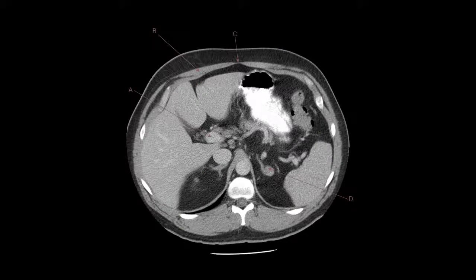Alright, structures noted again. What do we look at? You got your left suprarenal gland. So there's that. Also known, of course, as the adrenal gland. It's on top of the kidney because we're not quite to the kidney yet. They did define some anatomy structures. There's the linea alba. You got rectus abdominis muscles connected by the linea alba, and your portal vein, which is right here, right? What's this structure here? That should be your inferior vena cava. This one, aorta, hemiazygos vein, azygos vein.